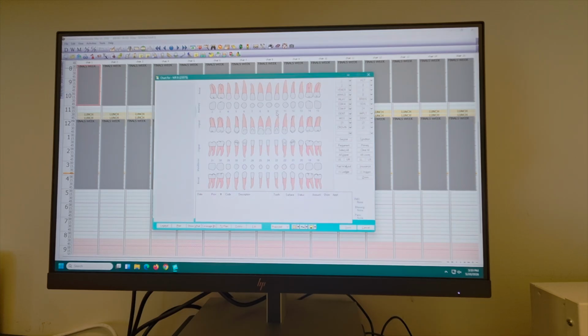In today's video, we'll be working on dentition charting. The important thing for dentition charting is to have quality x-rays and to look at a patient's EOIO, or intraoral, extraoral exam, so we can tell what's going on in their mouth. Combining the two, we can dentition chart that into our computer. For today's activity, we'll be using EagleSoft to do the charting.